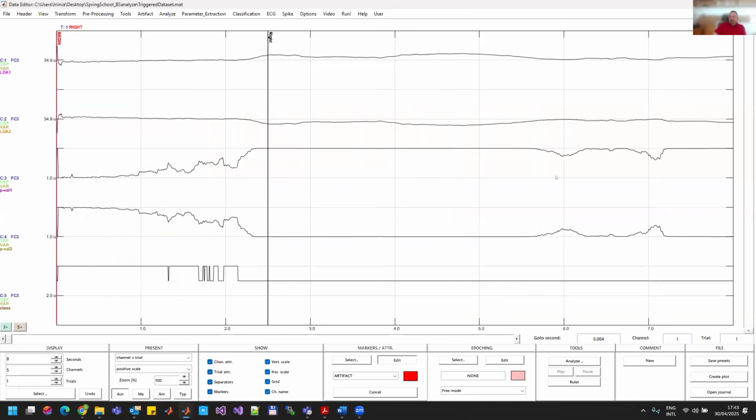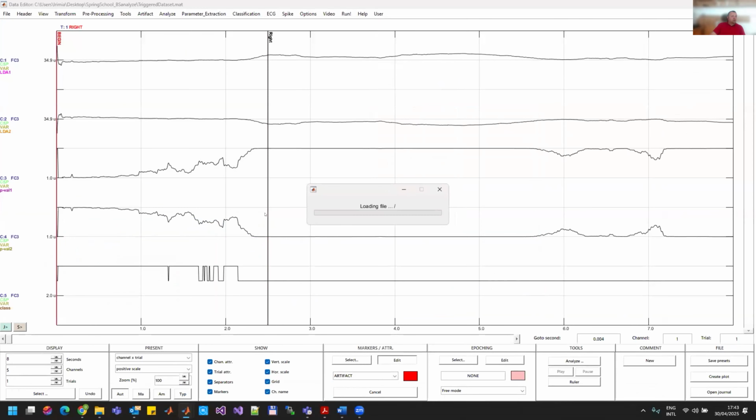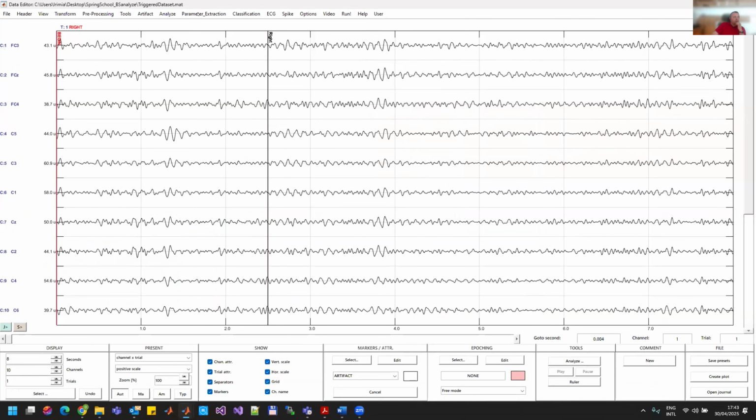But my session won't end in here. We are continuously working also on developing different ways of displaying this data, displaying results. So for instance, in the CSP part, we can see them in 3D. So I will just reload the dataset and start the common spatial patterns again.